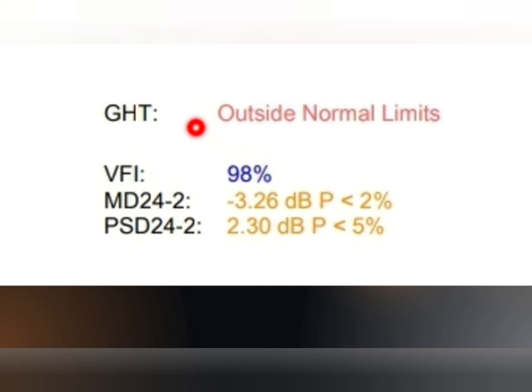And the visual field index tells the loss of visual field, right? Sometimes it appears as 98%, while some patients who have glaucoma and visual field defect have a visual field index of 70% or 60%. If the patient's visual field index is expressed as 70%, that means 30% of the field is lost and 70% is remaining, something like that.